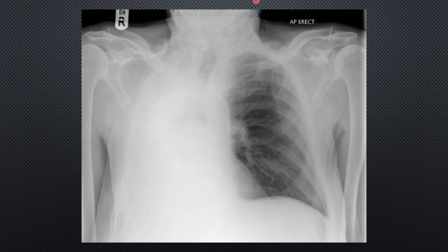And in this plain film, please pause, and you can obviously have a go as well.